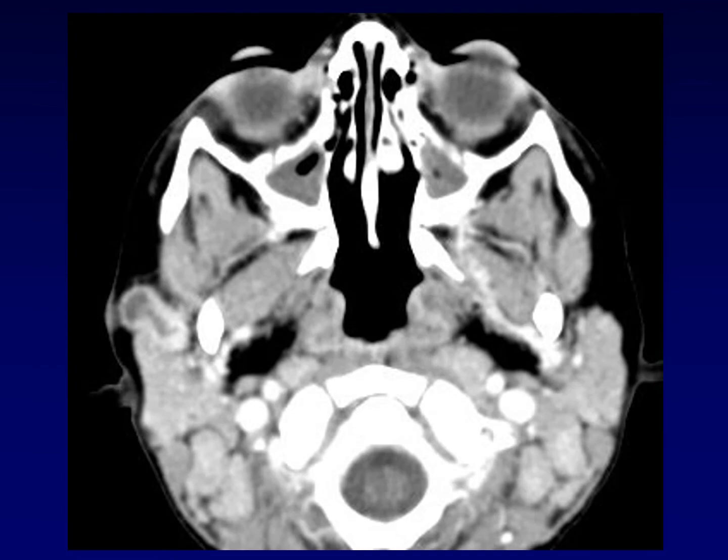Here's an example of a lesion that looks a lot like a type 1 first branchial cleft cyst. It has sort of a parallel look to the external auditory canal, although it's a little far away from the external auditory canal. It's taking the same basic course, and in fact that's what I thought it was when I first saw it, because this is a child, but it turns out this is a child with an infection.